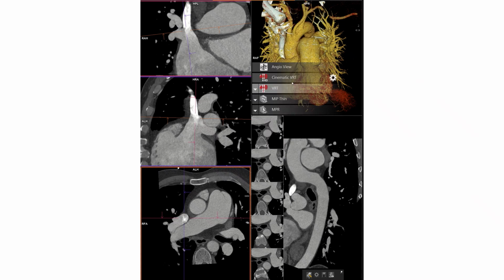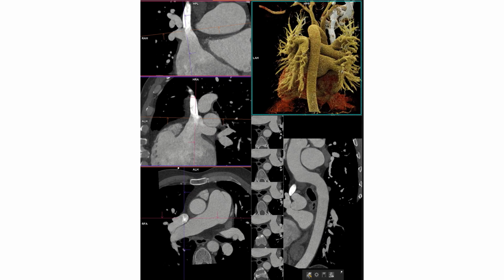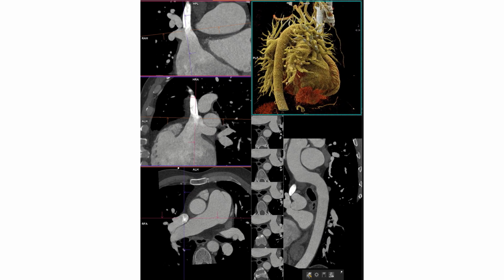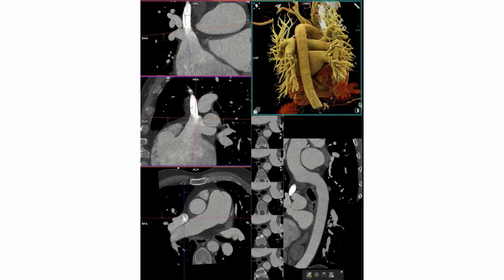Basically, you could take the level of the RPA as your landmark, or you could use the measurements from the left atrium up. I sometimes try to provide images to give them a clear appearance of how it looks in space around the partial anomalous. Of course, you could do all your measurements and punch out unnecessary vessels, and then give the appearance in reality.